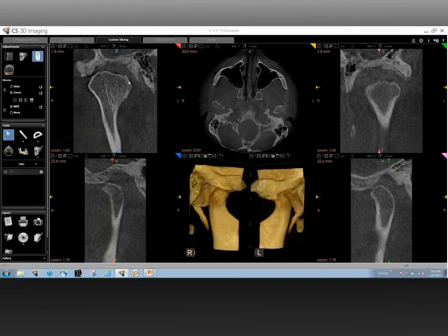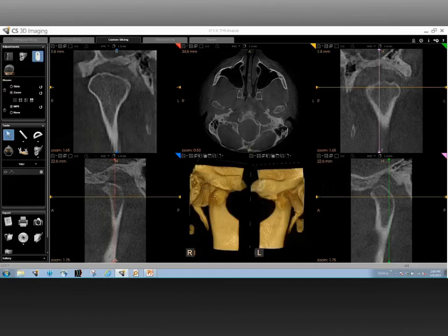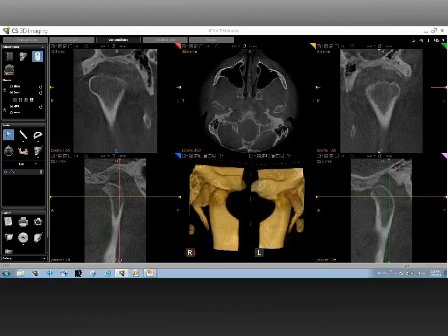You also see some sort of remodeling that's happening on the medial pole, which again indicates osteoarthritic changes. In fact, it's not really smooth and rounded, as I had mentioned earlier. There's a little bit of a corrugated kind of appearance, maybe a little bit of break in the cortical areas right there I'm pointing to, again indicating degenerative disease or bone remodeling. And then I probably would stop over there and show you that there's a remarkable loss of the cortical bone on the superior head of the condyle right there as we go further back posterior.